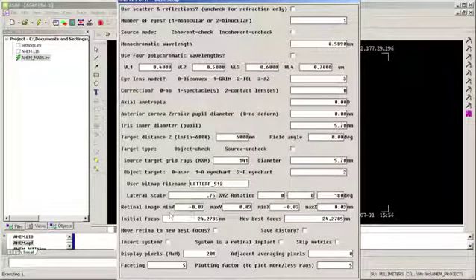Here's my retinal image window, so I specify how large a window I want to look at when that image projects to the retina. Then I have some other options here for focus. I've got an initial focus and a new best focus. Depending on what type of optics I've got set up in my eye, there will be some best focus for the retina. If I start changing things in my model, like putting in a lens or reshaping the cornea, I might create a new best focus.